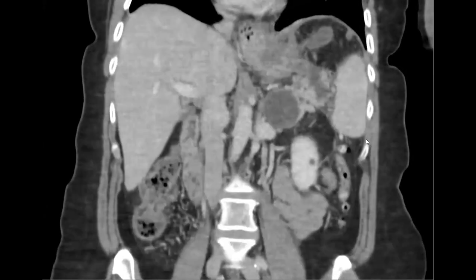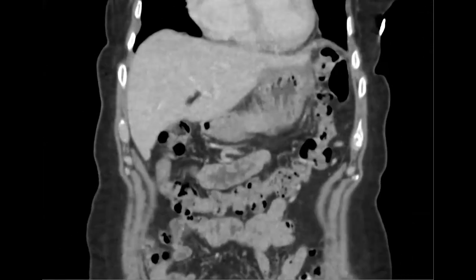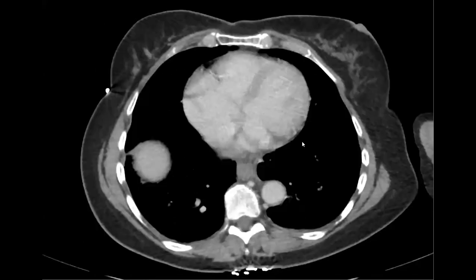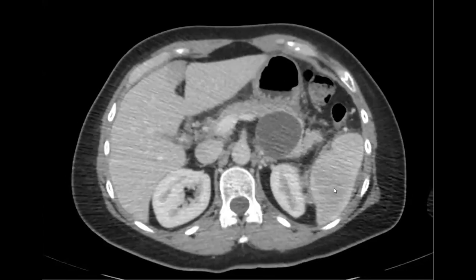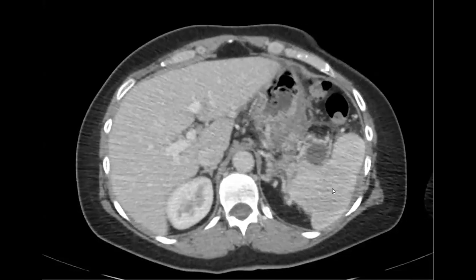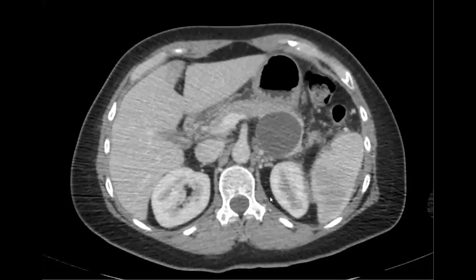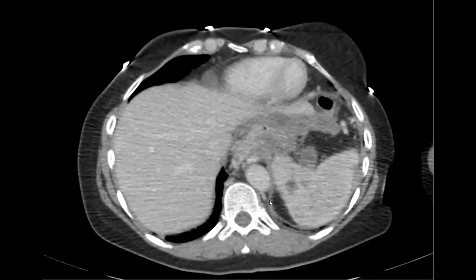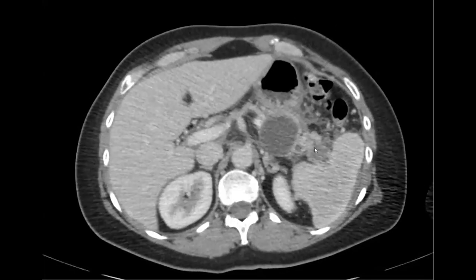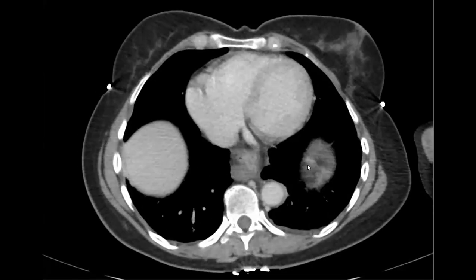There's ductal dilation in the tail only. The rest of the pancreas is all fine. There are a lot of inflammatory changes around the stomach. You said no trauma, right? No trauma. And then that pancreatic cystic thing, what do you think about that? Is it coming from the stomach? Why are you showing the stomach, and why is there inflammation around it? It's going up to the esophageal hiatus. I don't know if they're related or not.